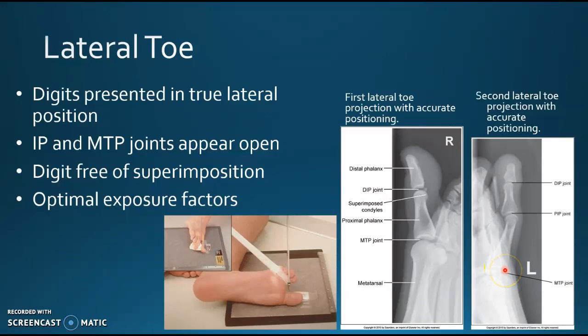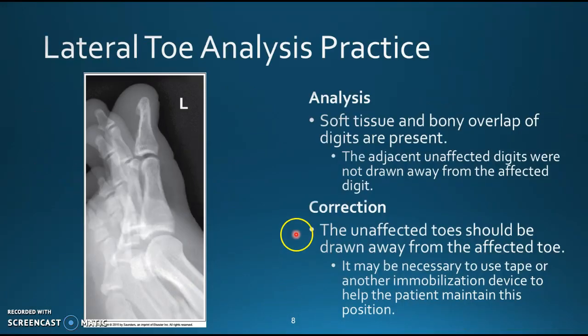You can see a small amount. However, the most of the anatomy of interest is the digit itself, and try to pull the toe away from the other toes.